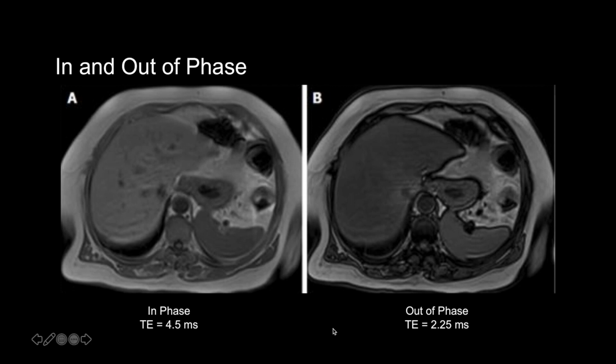If it was in reverse and the in-phase was acquired first and with a shorter TE, and there was a drop in signal on the out-of-phase image, we wouldn't really know if that was due to fat because they're out of phase or due to iron because it has a longer TE. If you take away one thing from this slide, know this. You've got to know how to detect intravoxel fat and iron/susceptibility artifact on the in and out of phase images. Namely, if it drops on the out-of-phase image, it's fat, and if it drops on the in-phase image, then it's susceptibility artifact like iron.